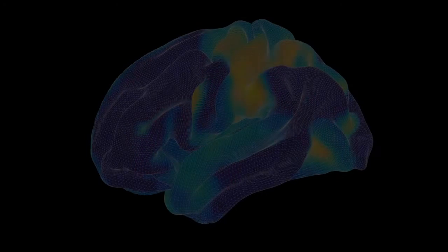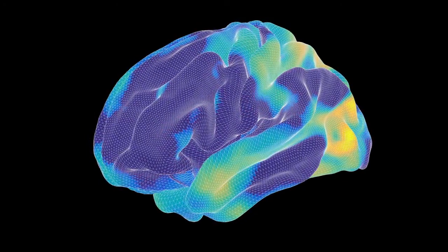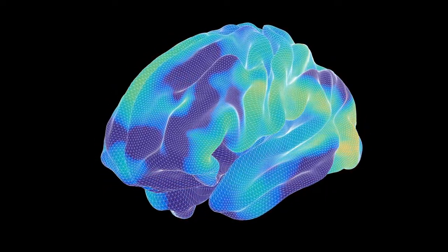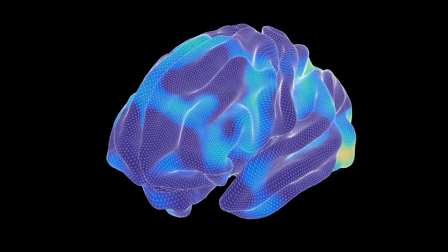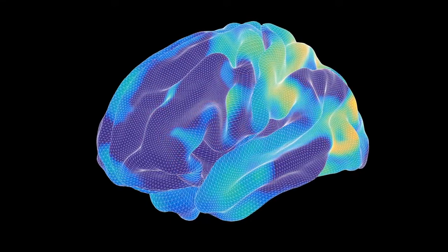We see images of the brain everywhere these days, but usually they are static and immobile. But in fact, the brain is never still. Functional MRI is here animated to show that even a resting brain is seething with activity. We analyze that activity with a technique called independent component analysis, which picks out distinct brain networks called components.